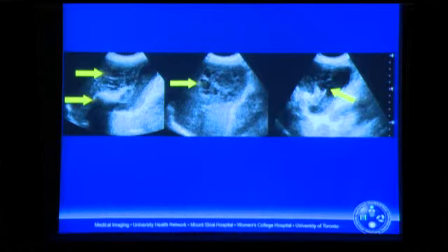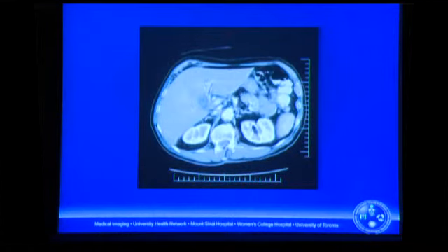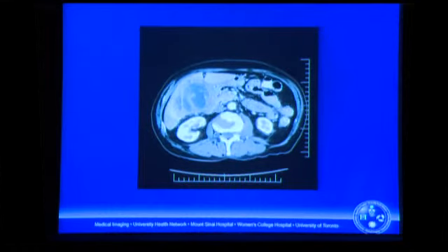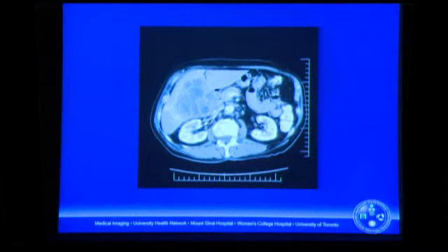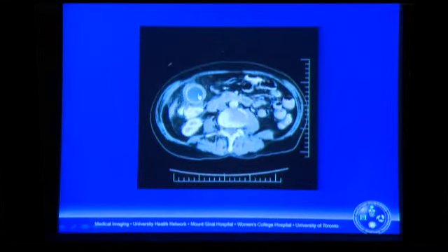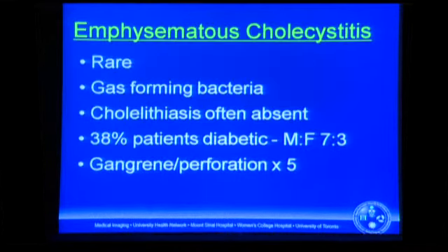And the literature tells us that CT and ultrasound are about equally sensitive at demonstrating that site of perforation. Now, in our practice, before our interventional radiologists drain an abscess like that, they generally like a CT scan to get a better overview. And here's the CT scan on that patient showing this large abscess in segment 5 of the liver. And if we take a select image here, CT also beautifully shows the site of perforation.